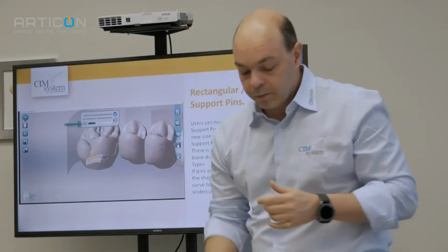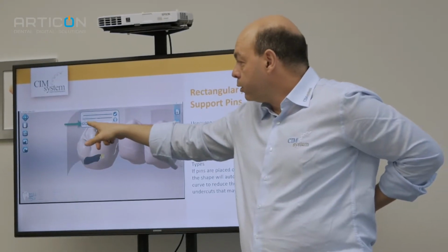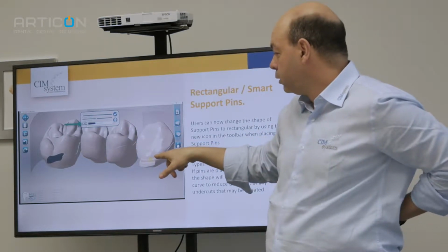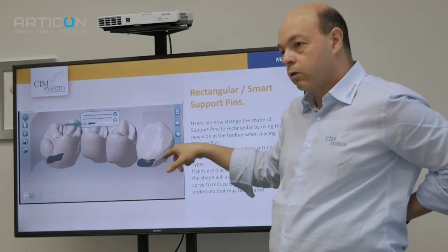Now I have one new shape of pins. It's rectangular. This is very new, and I like it because it follows the equator line.